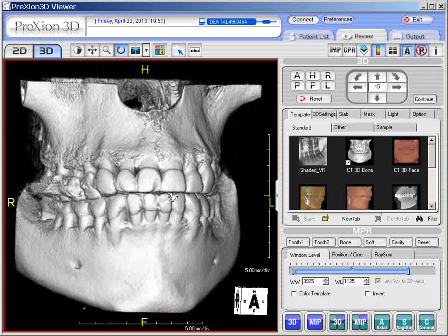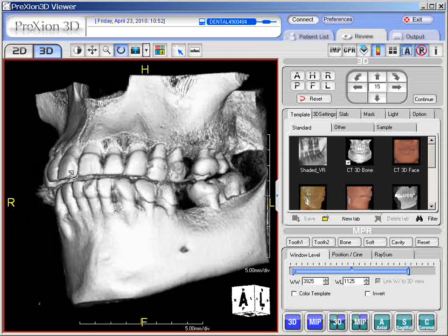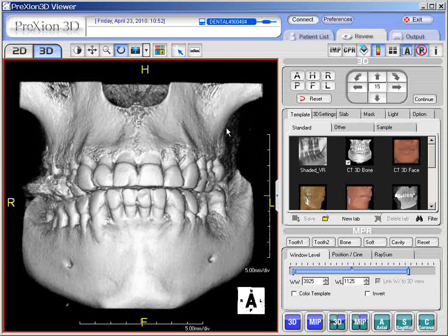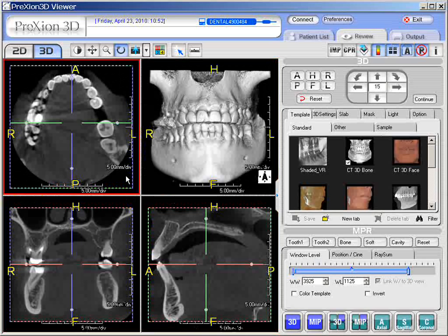As nice as the 3D looks, and as wonderful that you can look at all the different areas of the dentition from the field of view that you've captured, remember the multiple slices are going to yield your better definition and image quality, much as a radiologist would prefer to look at images as well. Okay, all right, that should end this little section discussing 3D, and we'll move on to a different section at this point.